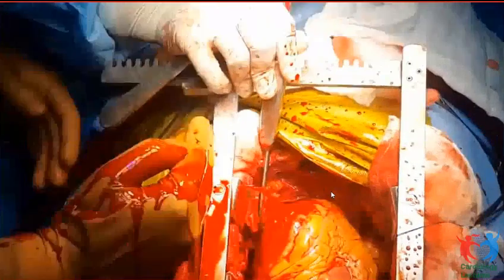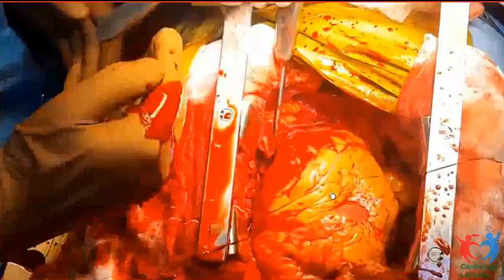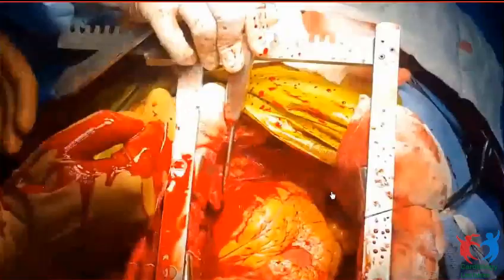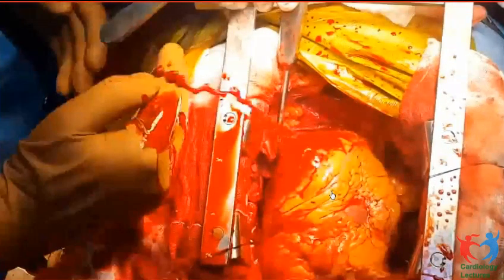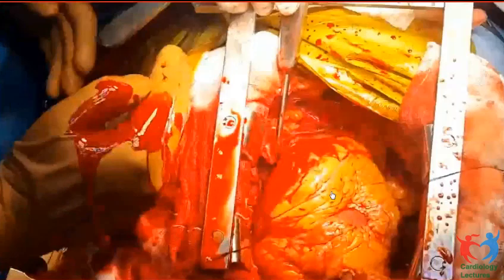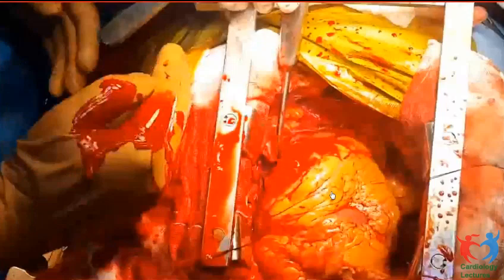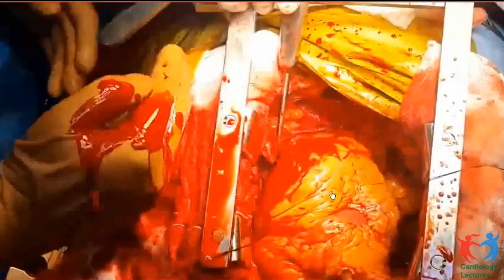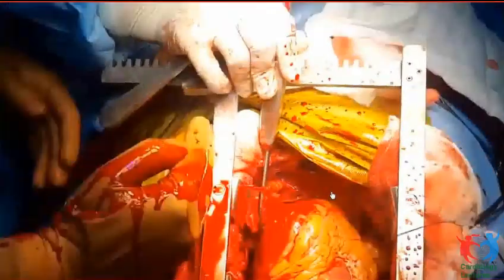You see this? Just to make it a little interesting, this patient had an anterior MI. On the second day had some chest pain and hypotension. If you proceed, you could see the rupture. It was close to happening.